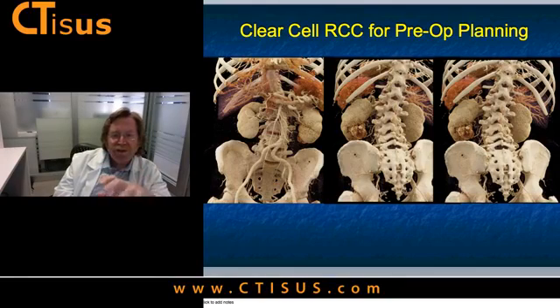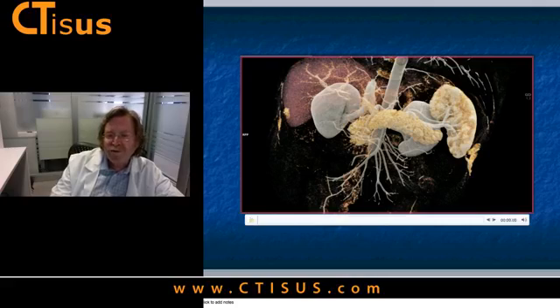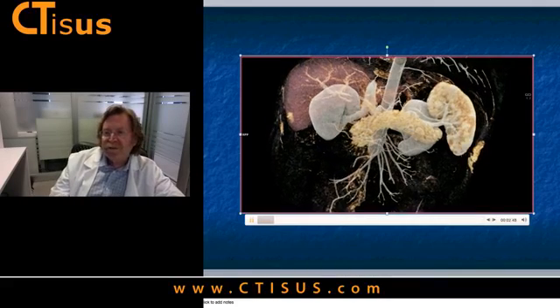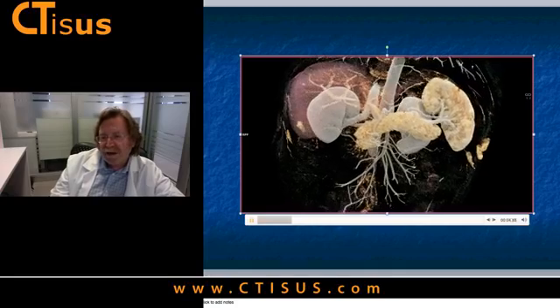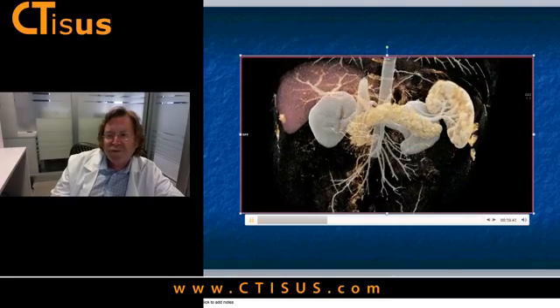So I think that becomes very critical. Now, you'll notice that everything I've showed you are static images, and for a while, I think the production product is only static imaging, but now with better GPUs and rewriting the code, you can do things interactively, and I think interactivity is really everything. And I thought I would show you just a couple examples of that interactivity, but I also wanted to show you this incredible rendering we've now come up with, which is a way of shadowing. And look at the vessels. The vessels are almost negative, but look how you see that GDA tracking over the pancreas.